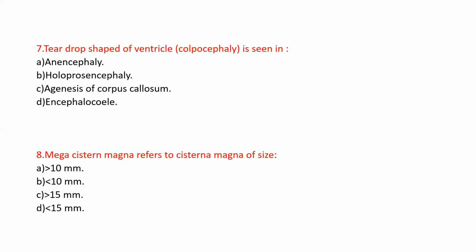Yeah, until recently, we used to believe that mega cisterna magna is an innocuous finding and is not associated with any other abnormalities. However, in the last 2 years, we've had several papers indicating that a simple measurement without looking at morphology may not be enough. And therefore, when we do spot something like this, it becomes important to refer again for a fetal medicine consultation, because it could very well be a problem.